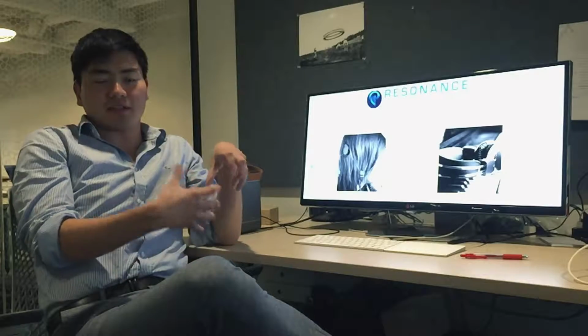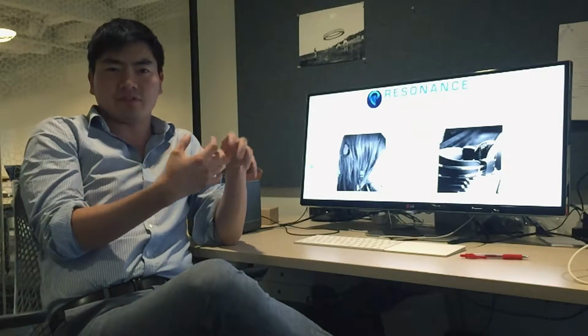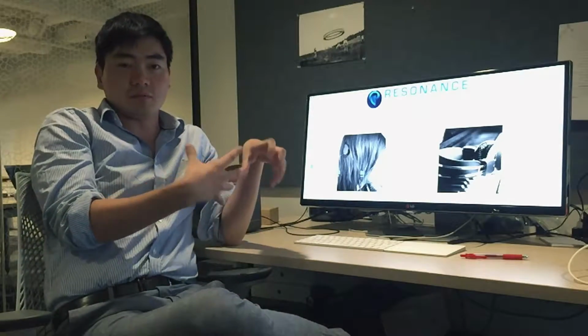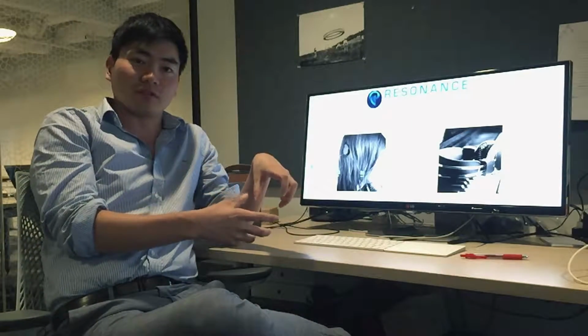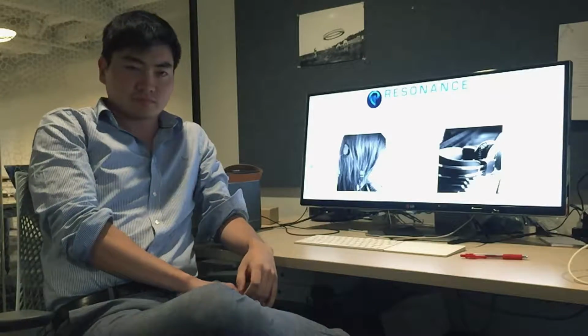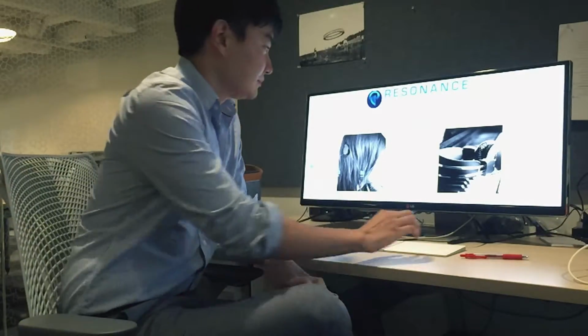And what I've done is actually simulated a type of unideal cochlear implant fit by removing a couple of the auditory filters that correspond to electrodes in the lower frequencies. So let's get started.